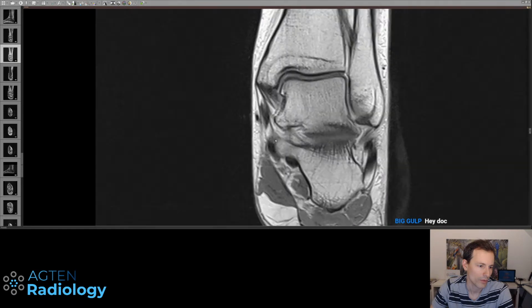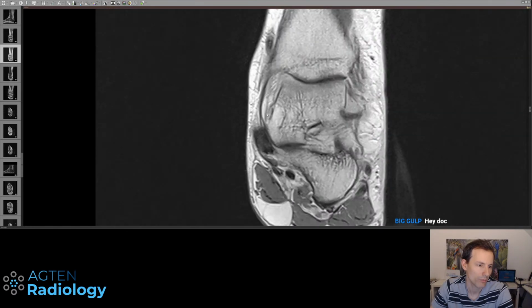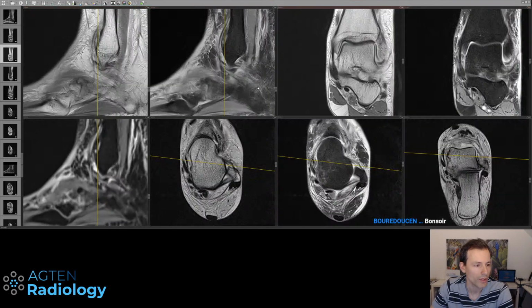portion here going to the calcaneus, then tibiospring, and the most anterior one, the tibionavicular portion, is sometimes just not visible. I wouldn't really care about it. Don't spend too much time trying to find it basically. So nothing acute going on here.